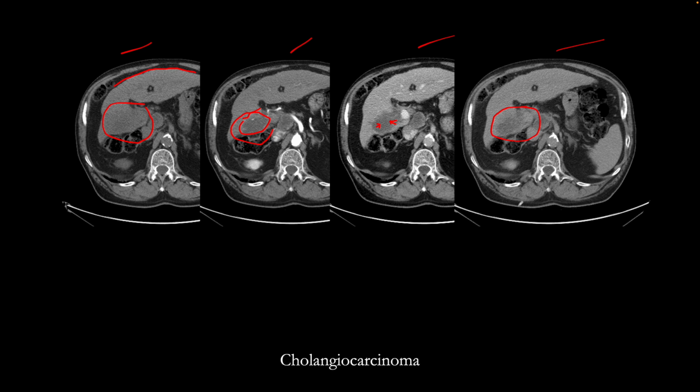This would be given an LRM, M for malignant or malignancy, when you are using the LI-RADS criteria to describe this tumor.